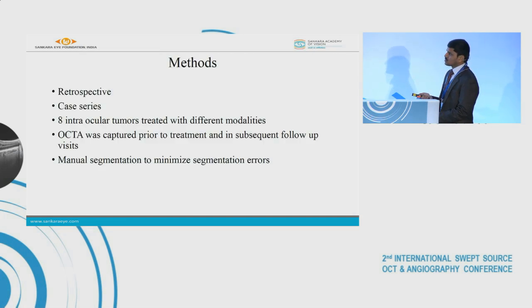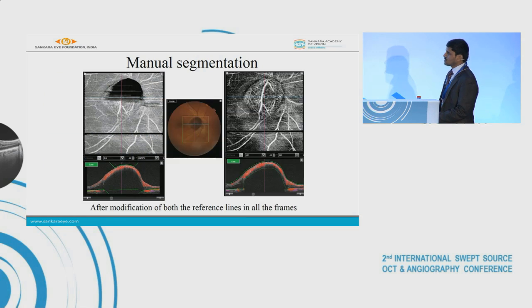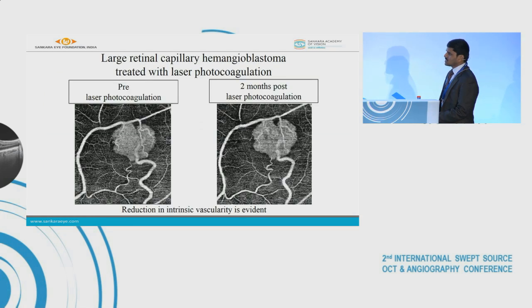So it's a retrospective case series of 8 intraocular tumors which were treated with different modalities. OCT-A was captured prior to treatment and in subsequent follow-up visits. Manual segmentation was done to minimize segmentation errors. So this is the same tumor which I discussed in the introduction.